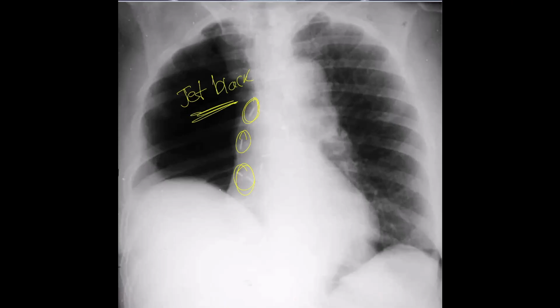So that's a very important differential if you have an X-ray in the exam where the stem says that the patient is post-operative or a heavy smoker, and then you see the surgical clips and this jet black appearance on the total right side of the lung. So you think, oh, is that pneumothorax? But the history, surgical clips, and jet black appearance give you an impression of a fresh pneumonectomy in the first 24 hours.